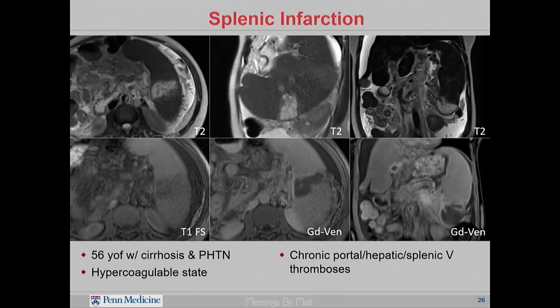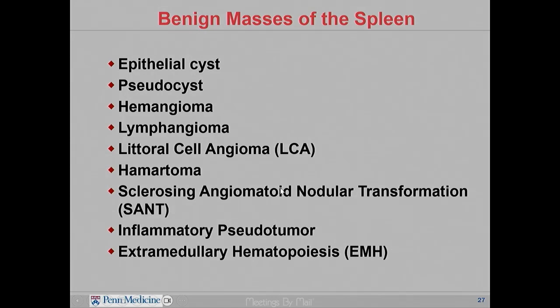Next, we'll talk about vascular conditions. This is splenic infarct. This is more acute to subacute, going to be T2 bright, wedge-shaped, with a broad base going all the way to the capsule, and non-enhancing. So we've all seen these on CTs for sure, and if you read enough MRs, you'll come across these.